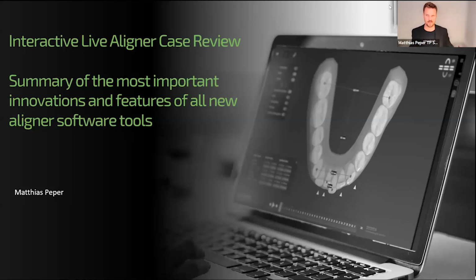So what we are doing today, again, I will give you a very interesting summary of the innovations, so we can also compare a little bit the different systems. And on the other hand, we will talk about how to use these different software tools, like an interactive live aligner case review.